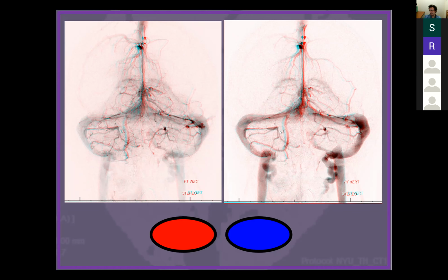And so on the right, the petrosal group drains into the superior petrosal sinus that extends posteriorly towards the sigmoid sinus. On the left, the opposite thing happens. The petrosal group is extending anteriorly towards the back of the cavernous sinus, which is here, and is draining out via the inferior petrosal sinus that you see right there. Okay, so all of that you can just put together like this.